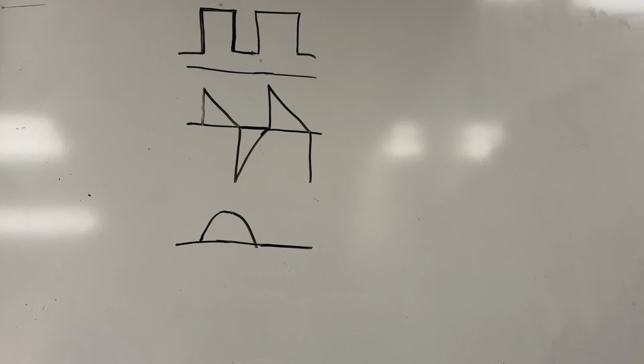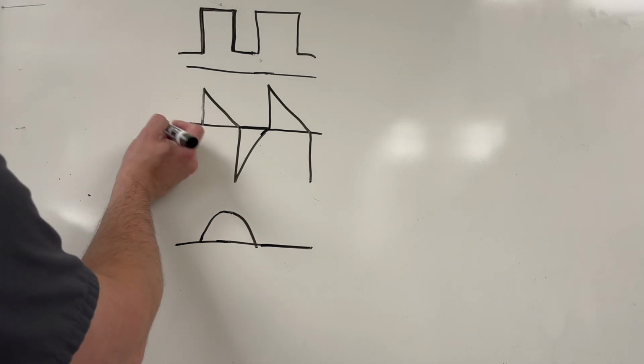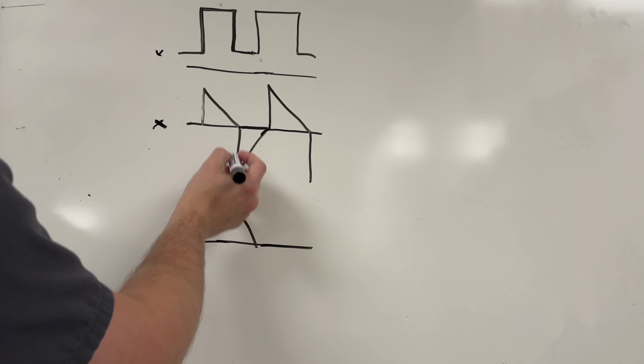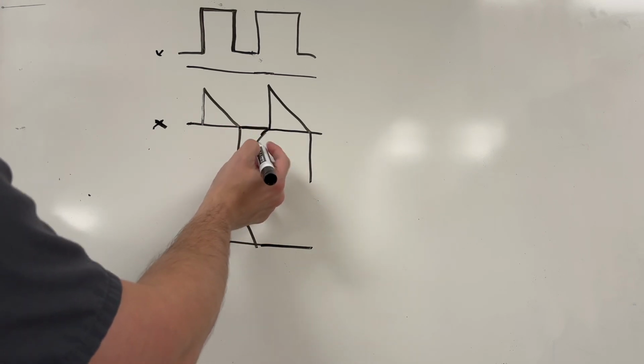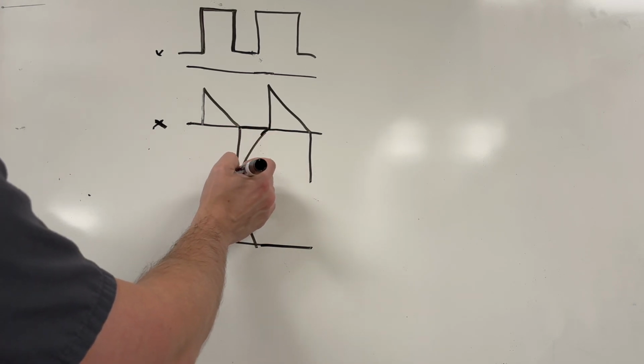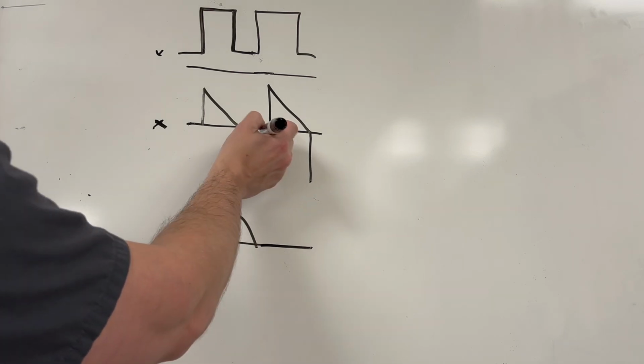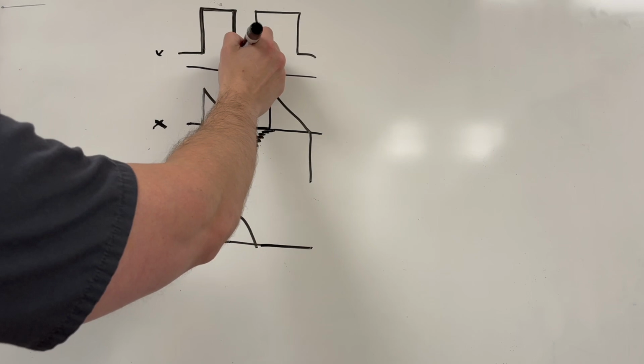If you have secretions, or let's say you have a bunch of water in your tubing, you're going to be able to see that on the waveforms as well. It's primarily going to be on the flow waveform, but you can sometimes see a little bit on the pressure waveform as well. It's going to be on this expiratory side of your flow waveform. When the patient's exhaling through, it's going to look like some squiggles coming up like that. You can sometimes see that here as well.